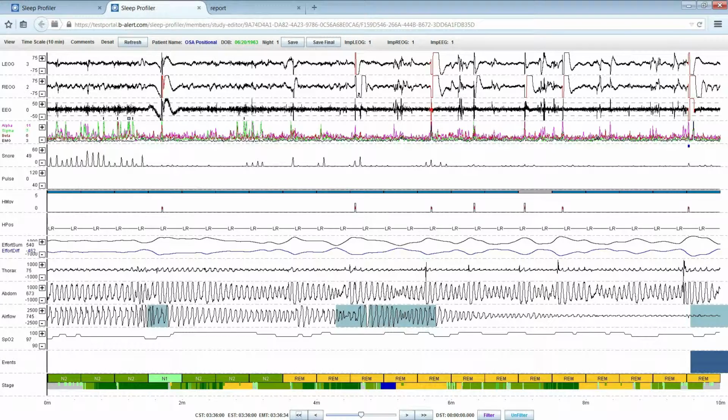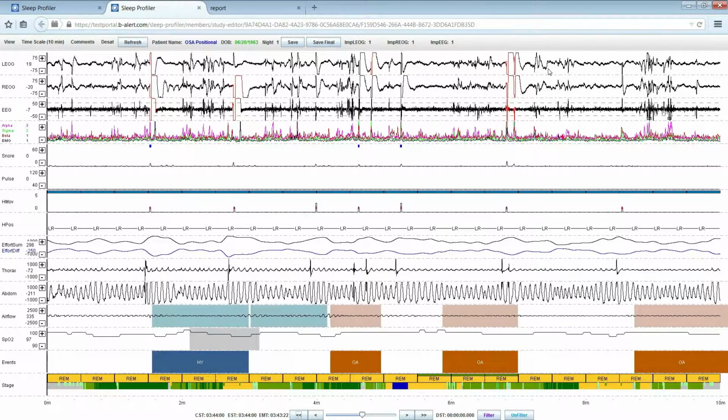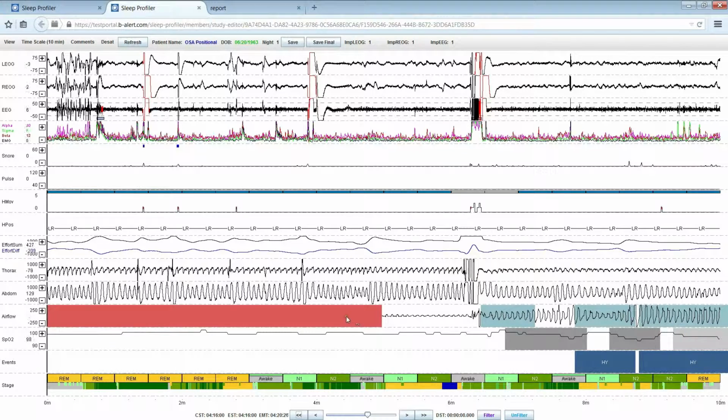Again, the transition from non-REM to REM activity. I will go into this period and look for the phasic activity. So I'm going to exit out, hitting the page down screen. Notice that the airflow signal is getting smaller and smaller, so I will increase it by pressing the plus arrow. And finally, the airflow is bad.